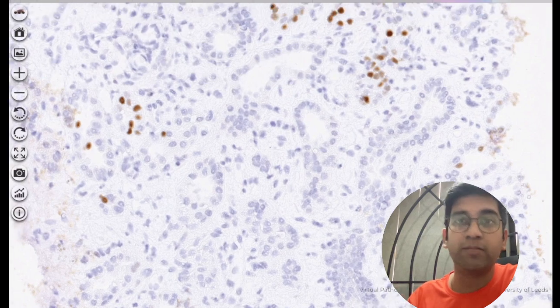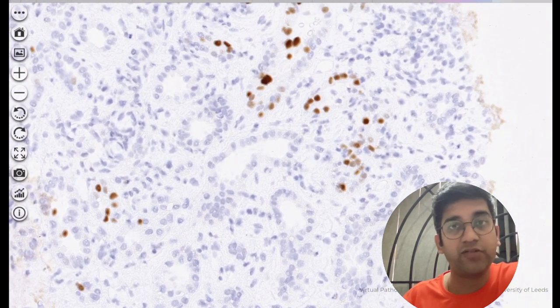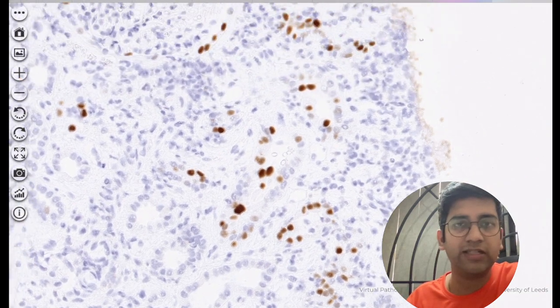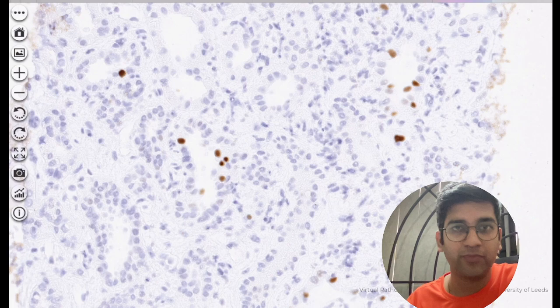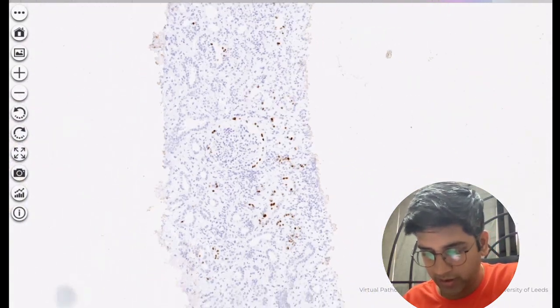So I'm not including the Banff classification for interstitial fibrosis here. We'll definitely look at that sometime later, right? That's a clear positive, right? That's a very, very good positivity here. You can see them, right? Okay, so that's about this case of polyomavirus nephropathy. This is very important for a PG aspirant who's sitting for the exam, be it MD or DNB exam. This might come in handy.